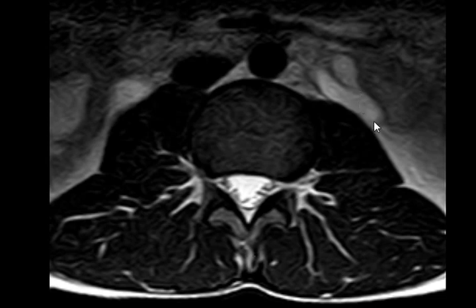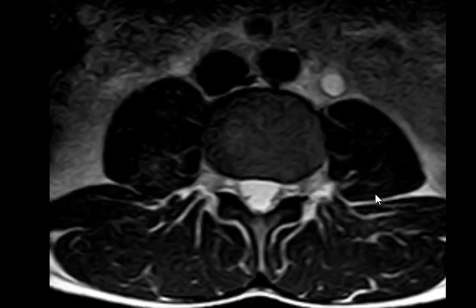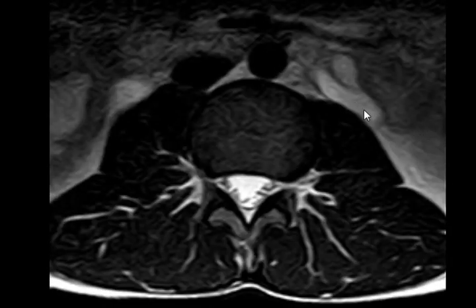These are renal bilateral hydronephrosis due to what? Someone has a spinal dermoid. Why would he have hydronephrosis? Neurogenic bladder, definitely. He has a neurogenic bladder with bilateral severe hydroureteronephrosis. Let's see, do we have a coronal myelo? See this one. Okay? So you are responsible for everything in the image.